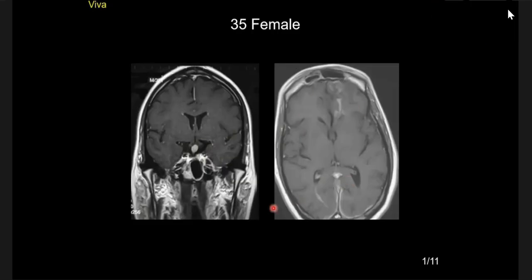Yes, there is patchy heterogeneous enhancement of the left frontal lobe. Okay, so you have picked up enhancement here. What's happening here and here? There is pachymeningeal enhancement posteriorly. Okay, so with this infundibular enhancement, dural enhancement, some parenchymal enhancement, which goes to the edge, what comes to your mind?